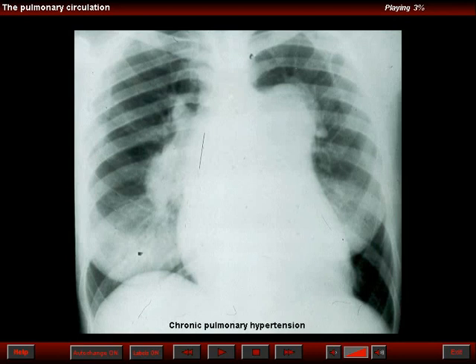This patient was suspected by a cardiologist to have hilar adenopathies. Note the marked convexity of the left pulmonary artery and pulmonary trunk, and also the convex right pulmonary arterial hilus. All these are enlarged pulmonary arteries, and what the cardiologist failed to recognize was the oligemic peripheral lungs.